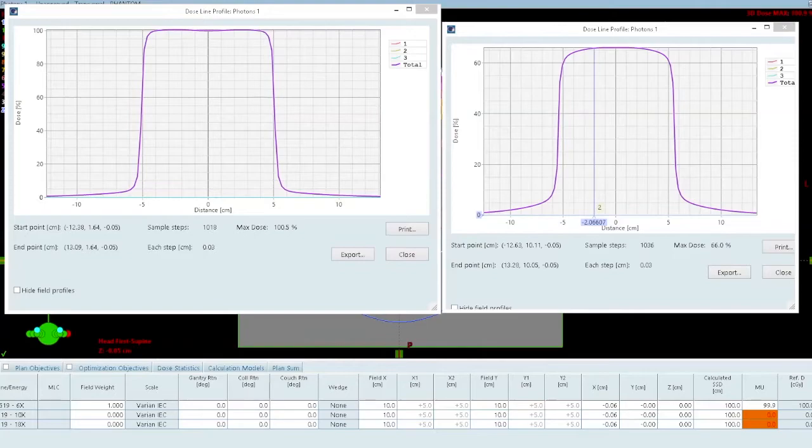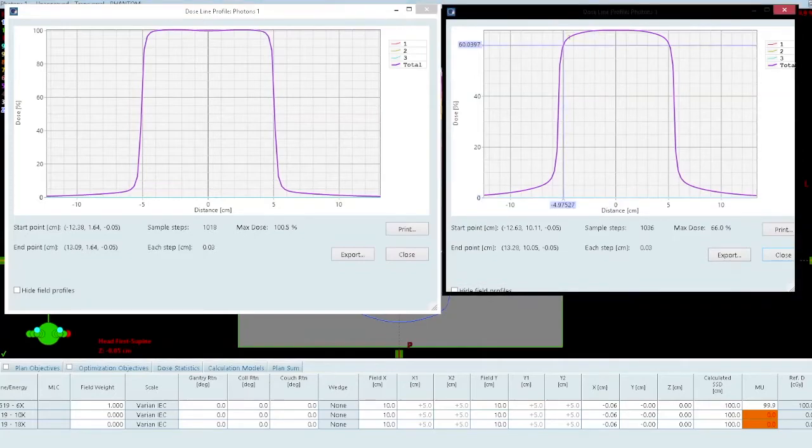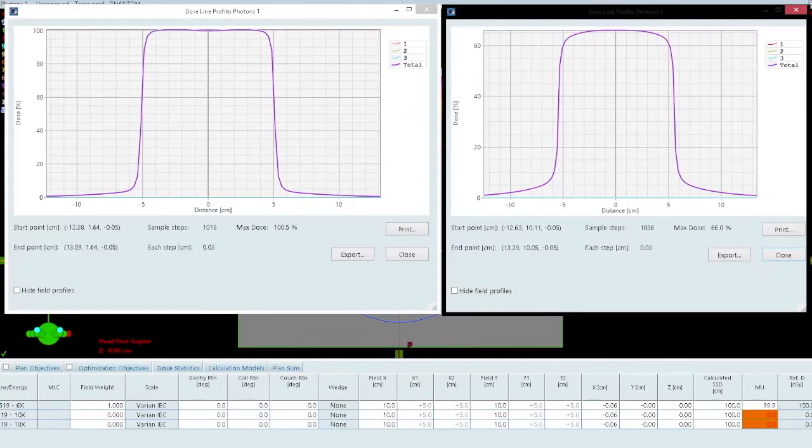So you can see how the two look different. Here, these distinct horns at 1.5 centimeter deep have gone away. So now at 10, I have a slightly rounded shoulder, a slightly more rounded shoulder.